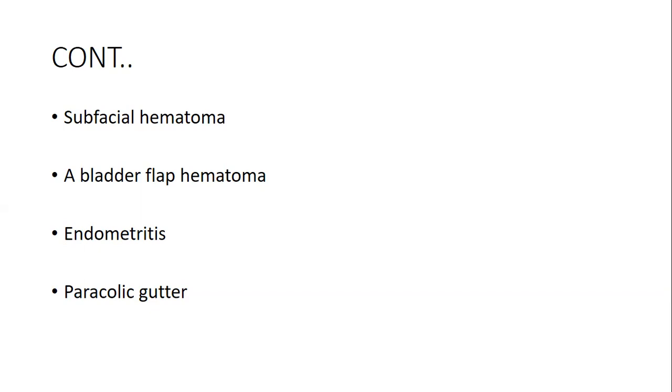I should mention that these subfascial hematomas, sometimes they may also develop into scar endometriosis. That may also present there, because sometimes the endometrial tissue may also be left within the scar, and this may give rise to that. A bladder flap hematoma, which is one of the most common lesions, may also be found.